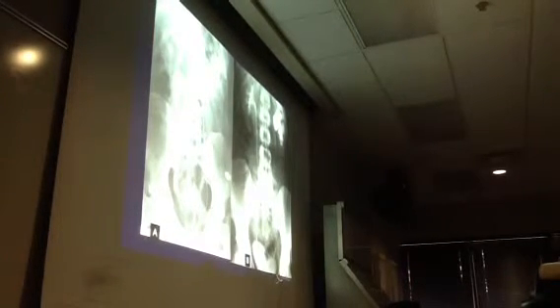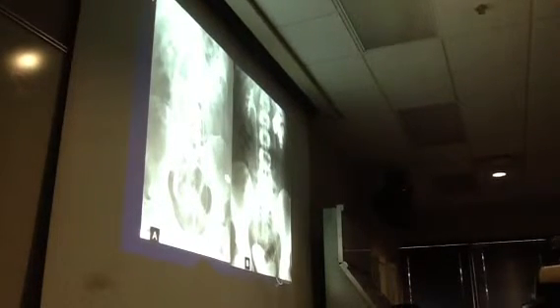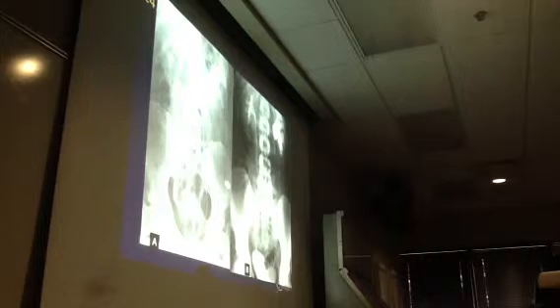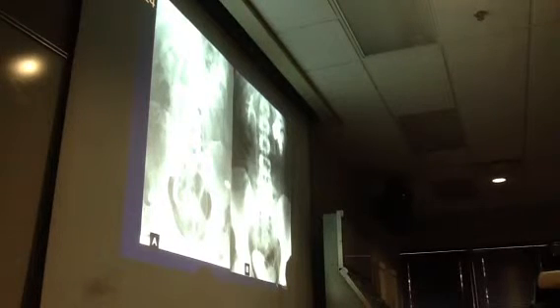So when you get this question on your lab final, you've got to look for the catheter, because the catheter is what's giving it away. If you see the catheter, it's retrograde, it means the contrast got in there via the catheter. And you can just imagine how painful that is. Abbreviation is IVP for intravenous. And the IVP, intravenous pyelogram, the contrast got there via IV.